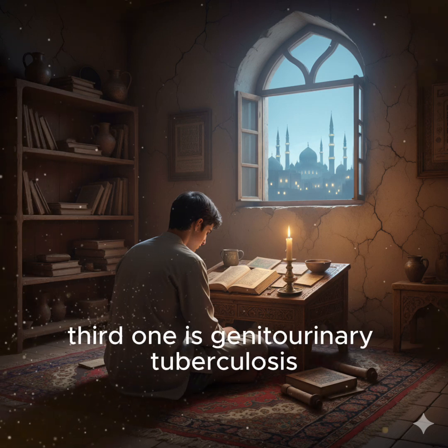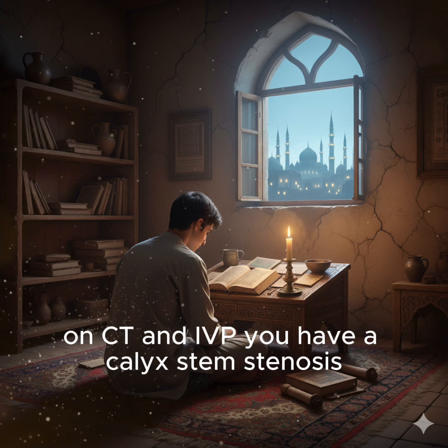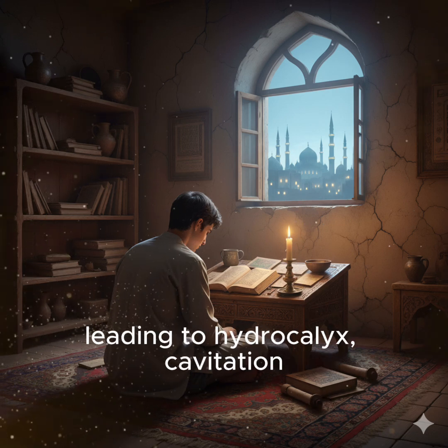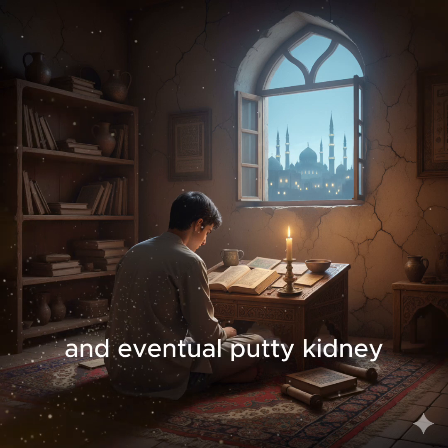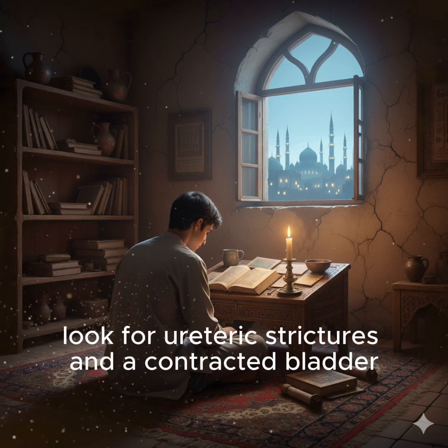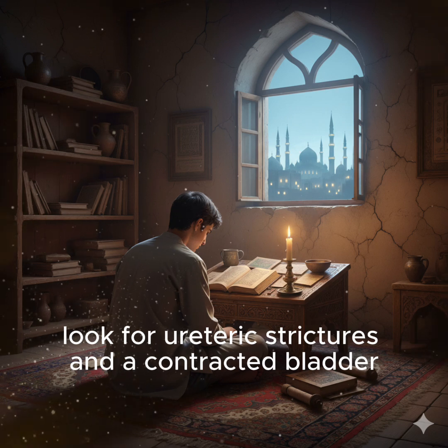Third one is genitourinary tuberculosis. On CT and IVP, you have a calyx stem stenosis leading to hydrocalyx, cavitation, and eventual putty kidney, caseous material calcification. Also look for ureteric strictures and a contracted bladder.